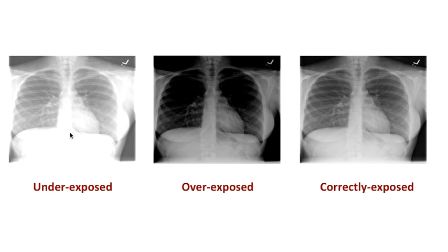So it appears more white, right? On the other hand, this is an overexposed film, so everything appears too black, right? You can easily make out vertebral bodies, and intervertebral discs are clearly visible as a black line. This, on the other hand, is a correctly exposed film, right? So this is the right exposure. This is what we want. So neither underexposed nor overexposed.